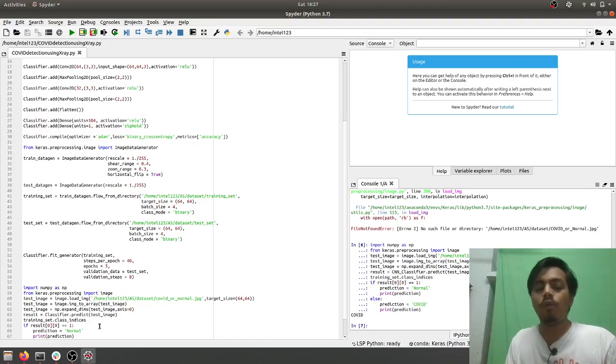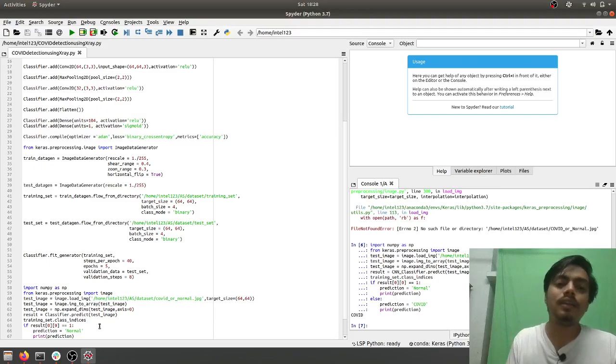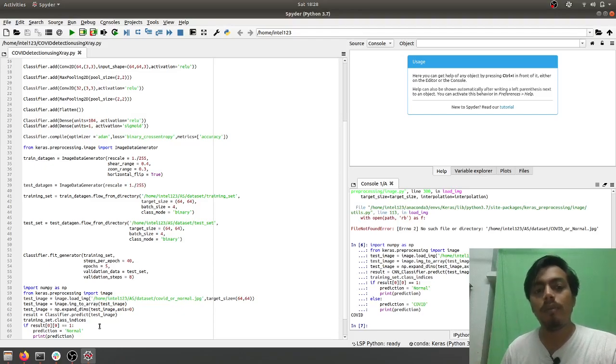So what we'll be doing here is using image data augmentation for increasing the number of images, adding different variations. Generally we do this augmentation with the help of the ImageDataGenerator class of Keras preprocessing, and we have two options here. The first option is flow_from_directory, and the other one is flow.